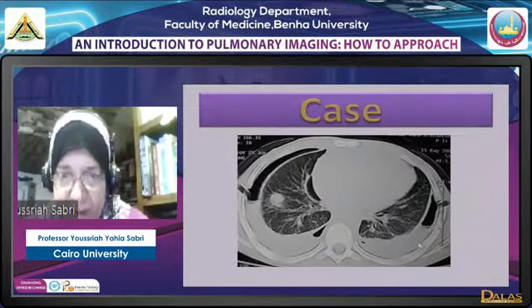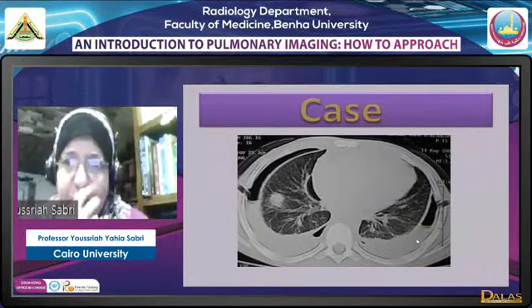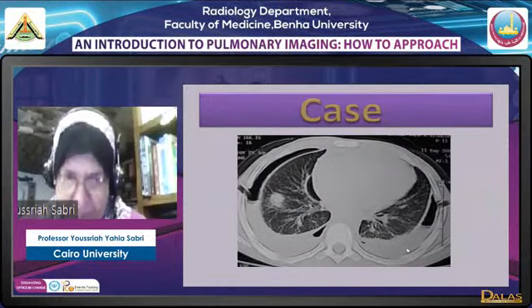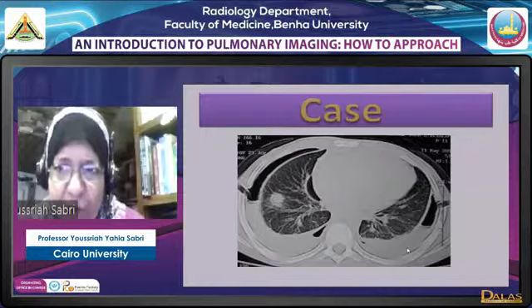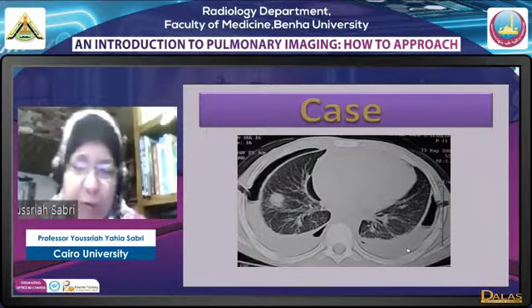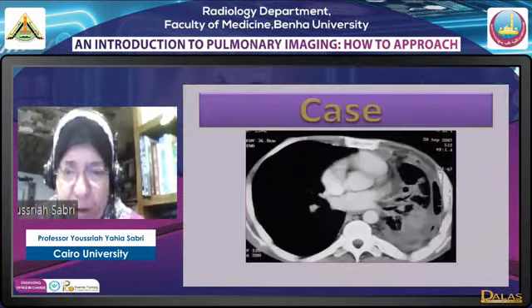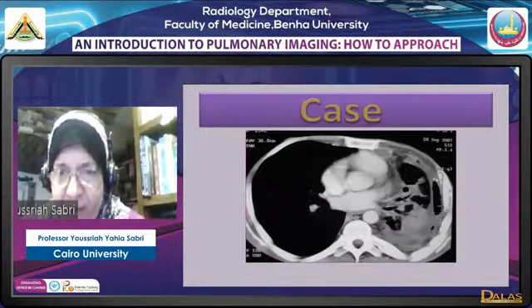Bilateral multiloculated hydropneumothorax, and in this case we have intercostal tubes, so we will not consider the possibility of a bronchopleural fistula. As I said before, if we see a loculated hydropneumothorax related to an inflammatory lesion, we have to consider a bronchopleural fistula, especially if there is no tube put. Here we have a bronchopleural fistula. There is marked pneumonia, complicated, and a loculated hydropneumothorax without a tube.